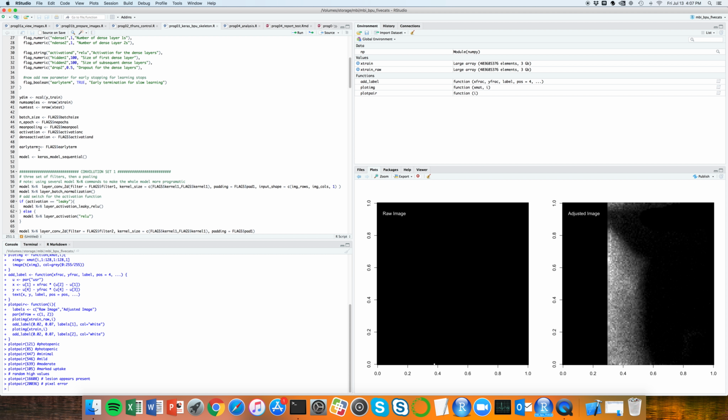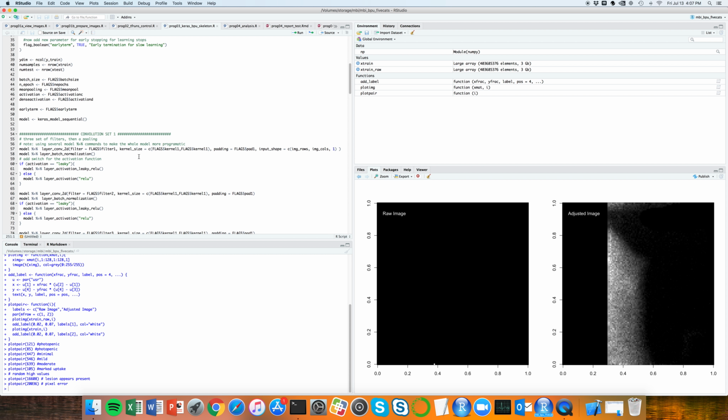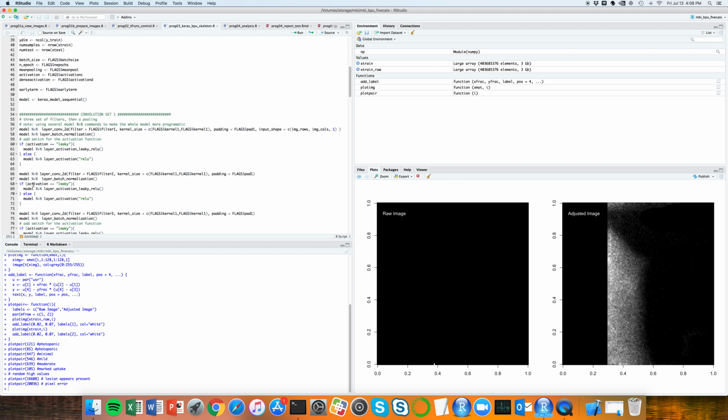Go through, you load the data, you do some different counts to set up the Keras model architecture. For those that are used to fitting Keras within Python, or native Python, you would see a model dot, and then you specify the architecture being applied. Within R, it looks very similar. You define a Keras model as sequential, and then you use this piping layout to basically take the prior iteration and add to it. You can do this a variety of ways.